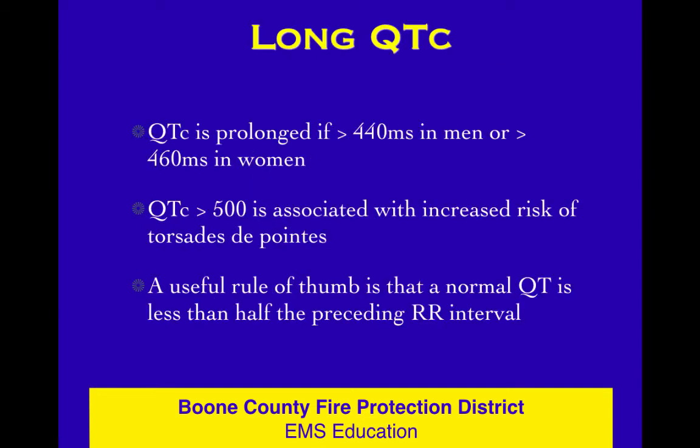So, what is a long QTC? Well, it's different for guys than it is for girls. I don't know why, it just is. 450 is kind of the average there. So I would say the QTC is prolonged if it's more than 450, but we're definitely worried if it's more than 500. There's a fair amount of debate as to what is a normal QTC or what is considered prolonged. So we're going to go with 450 technically, but 500 makes me really worried.